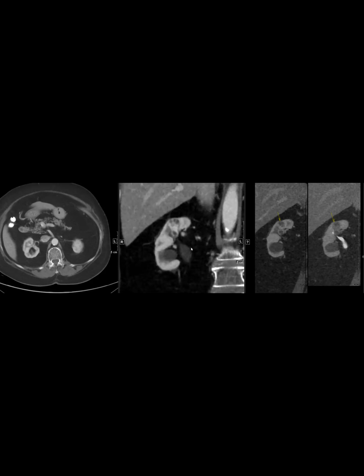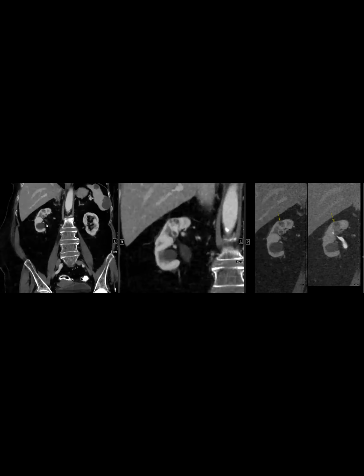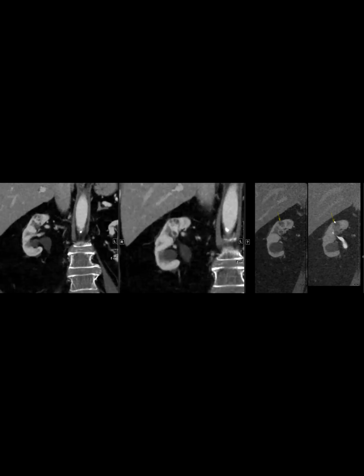Well, all these thingies are little cystic spaces. And obviously this is not something that can be called prospectively. Yeah, a lot of these are surgical anyway. Right. So we just called it a complex cystic and solid mass. I don't know why it's jumping. I apologize. Bosniak, took it out. Right. So this would be Bosniak 4, but in retrospect, you can see it does herniate into one of the calyces. And this was a middle-aged woman, so that works, right? In terms of the demographics for this patient.